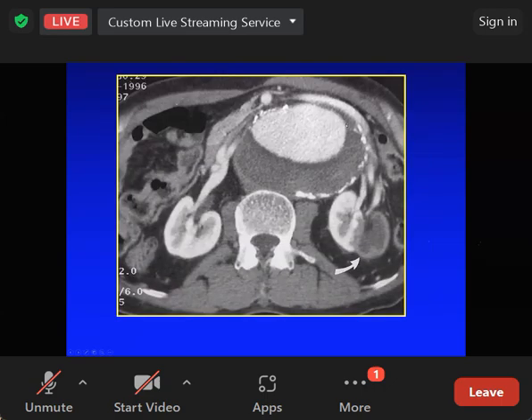Okay, here we've got something that I always think looks a bit like a fried egg. This is a contrast enhanced scan. You can see you've got contrast in the renal arteries. I think these are renal veins here, actually. So, we've got this rounded structure with white bits on the outside. What are these white bits? Same as bone, calcification. So what calcifies like this?